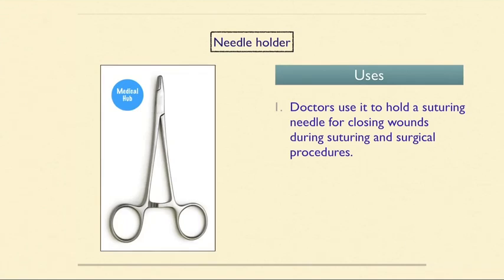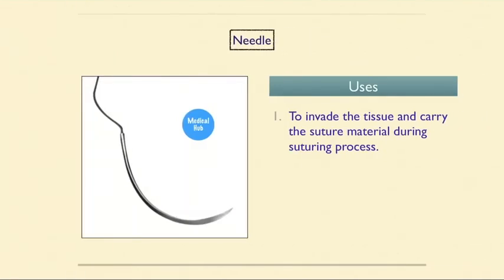Our next instrument is needle holder. Doctors use it to hold a suturing needle for closing wounds during suturing and surgical procedures. Next instrument is needle. Used to invade the tissue and carry the suture material during the suturing process.